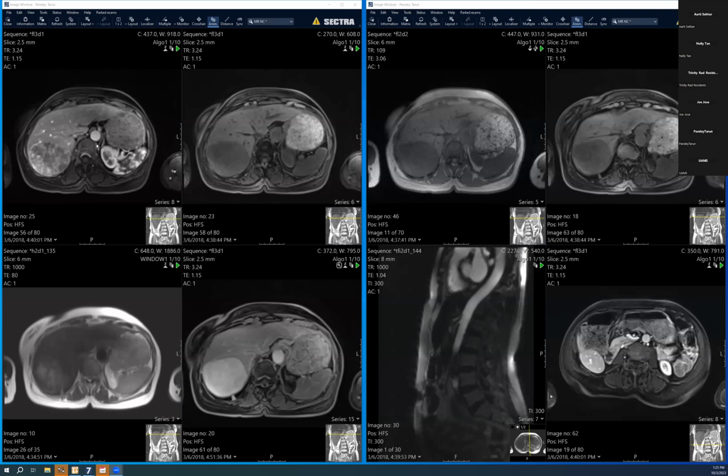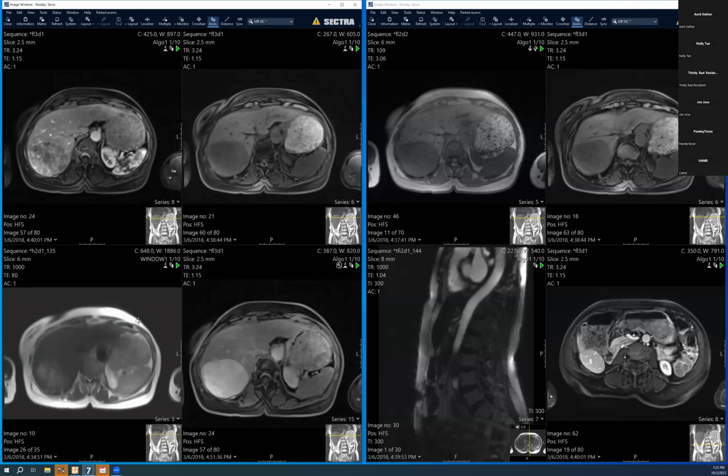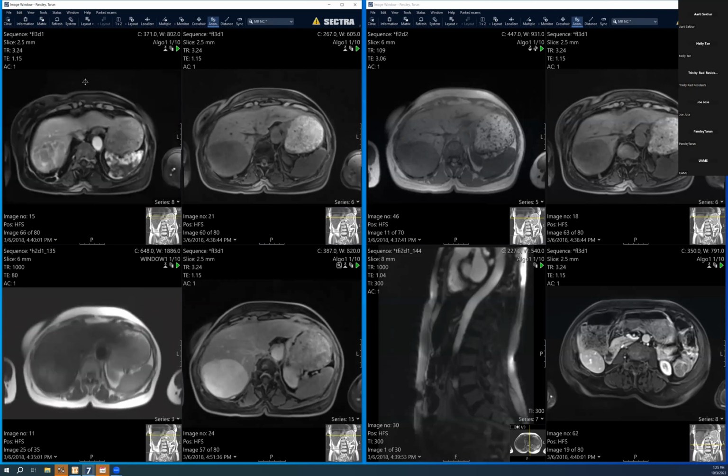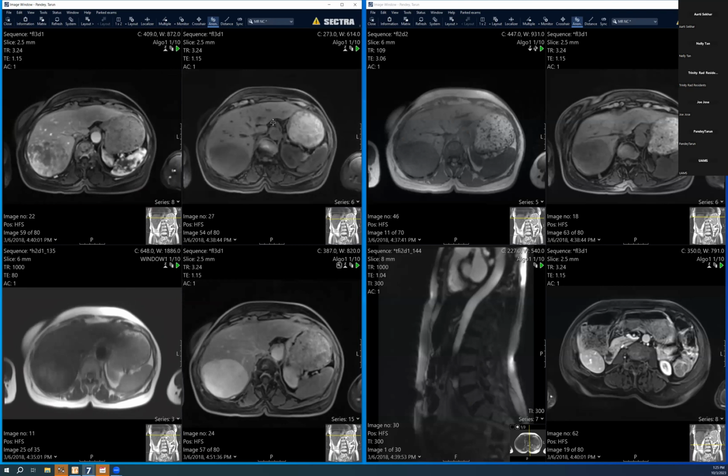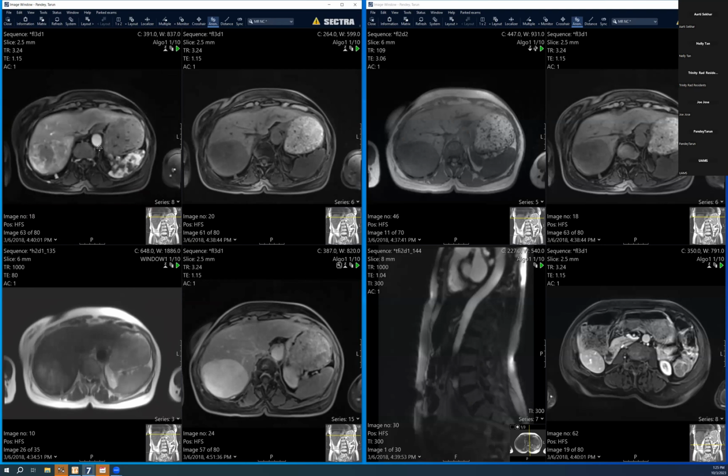Okay, so the patient has a history of multiple myeloma. Plasmacytoma. I was going to say, but in Arkansas they call it EMD, extramedullary. Oh, okay. So look at the signal intensity. Very blobby, T2 heterogeneous, delayed, progressive enhancement. T2 signal in particular is kind of dark. Yes, exactly. And this is the arterial phase here, and this is the most delayed phase we have.